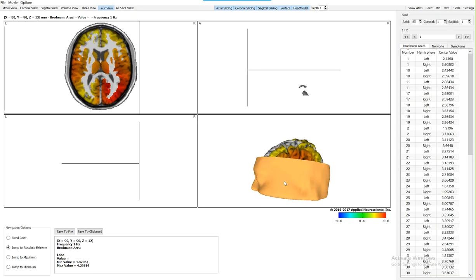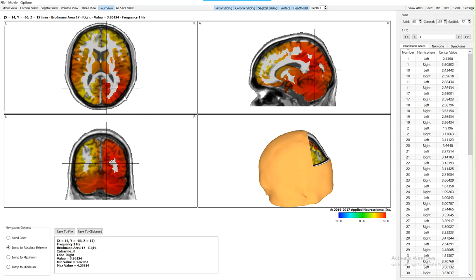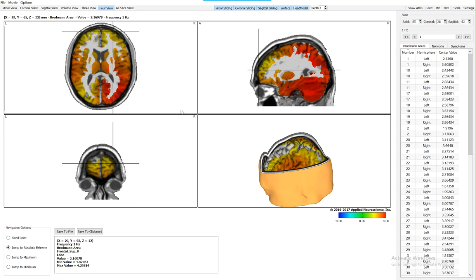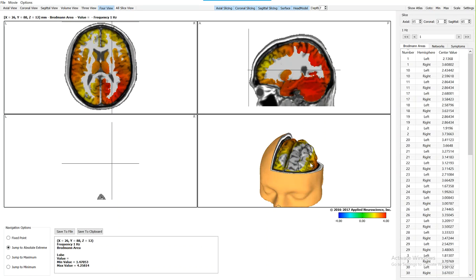But with the skull completely rendered at the top, we can then project electrical potentials from the various electrodes. Like on this skull here, we can put electrodes or the electrical potentials generated by the sources inside the brain, and then look at segments and quadrants, left and right hemisphere, for example, with the sources that are being projected to the scalp surface.